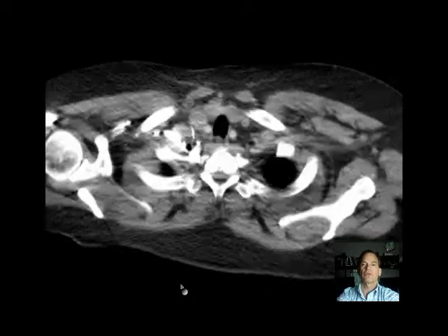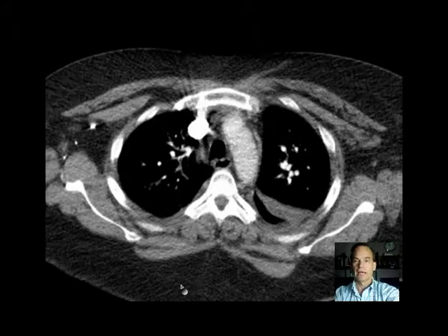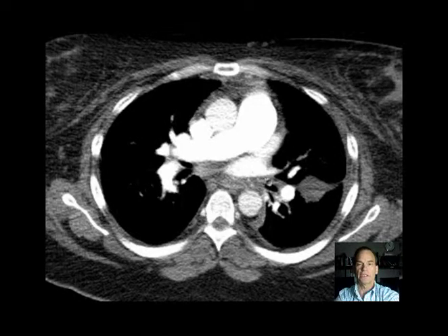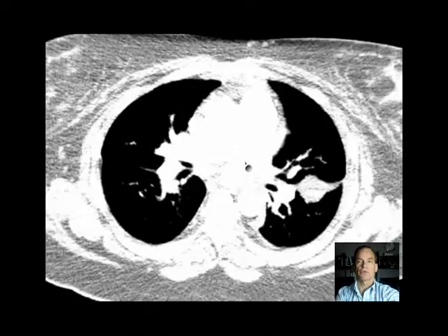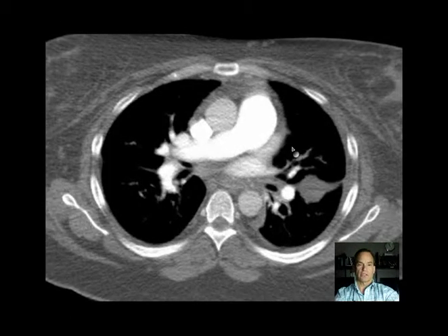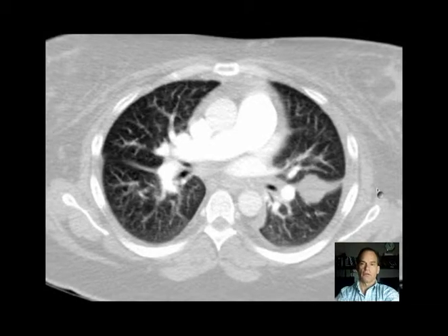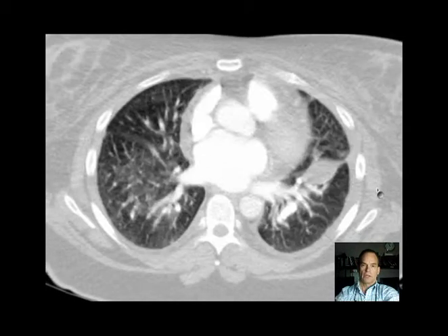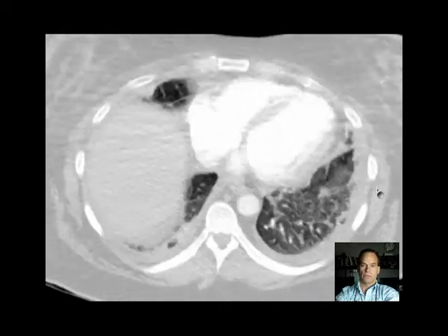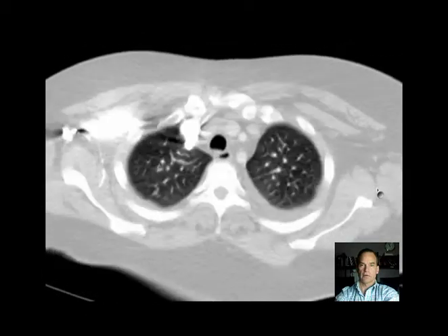And we don't see this very often on CT. We usually see it on chest radiographs, which are quite adequate for making a diagnosis. But this shows us a little bit more detail, and that's what I wanted to share with you. So, let's just look over the chest, make it a little bit lung related here. And we'll go down through the bottom and come back up through the top, give you an overview of what we're going to be looking at.